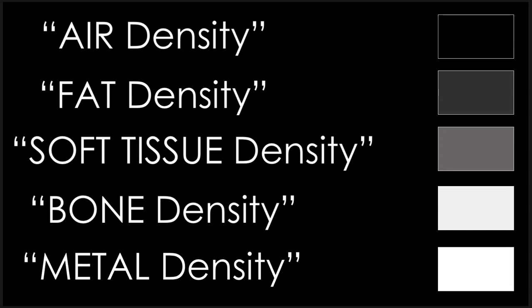So air in the lungs, or air in the pleura, or skin, or mediastinum, is going to be this black color relative to soft tissue density, which is going to be more on the whiter aspect of the grayscale. So that's what we're going to be looking for. Things that are too black, out of place, other than the lungs.